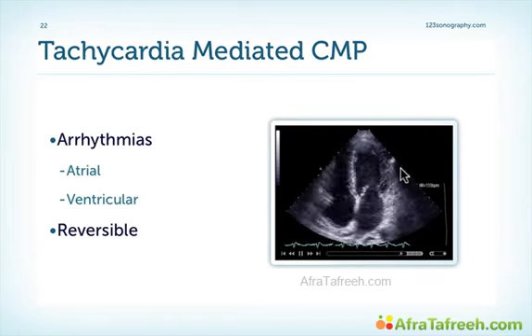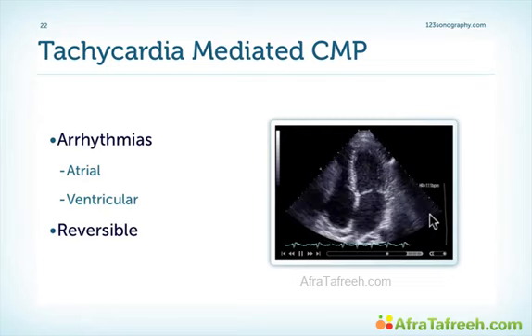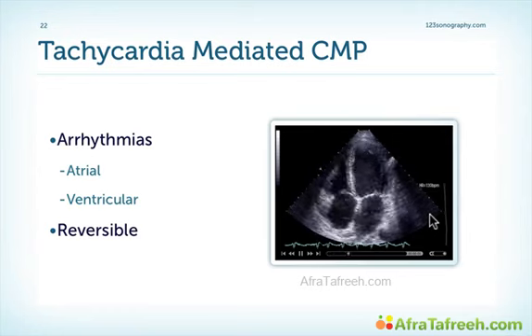This is an example of a patient who had rapid atrial tachycardia due to atrial fibrillation, where we can find a reduction in left ventricular function. However, you have to be aware that in general it's very difficult to really assess left ventricular function if patients have tachycardia. This phenomenon of tachycardia-mediated cardiomyopathy is reversible.